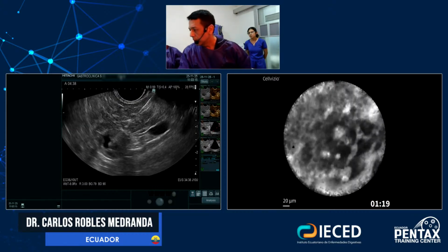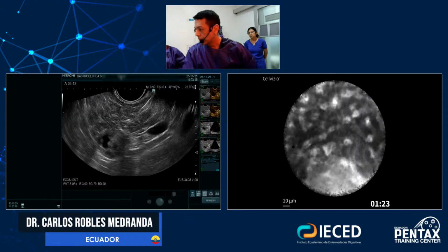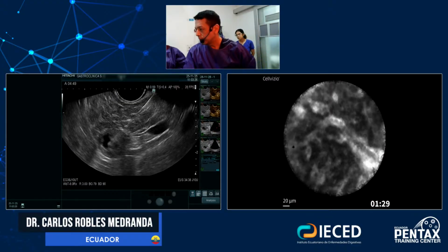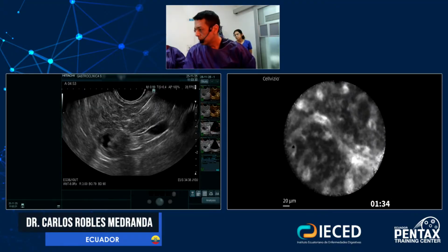No. So this area is very interesting and very particular. Oh, look at this. Oh wow.